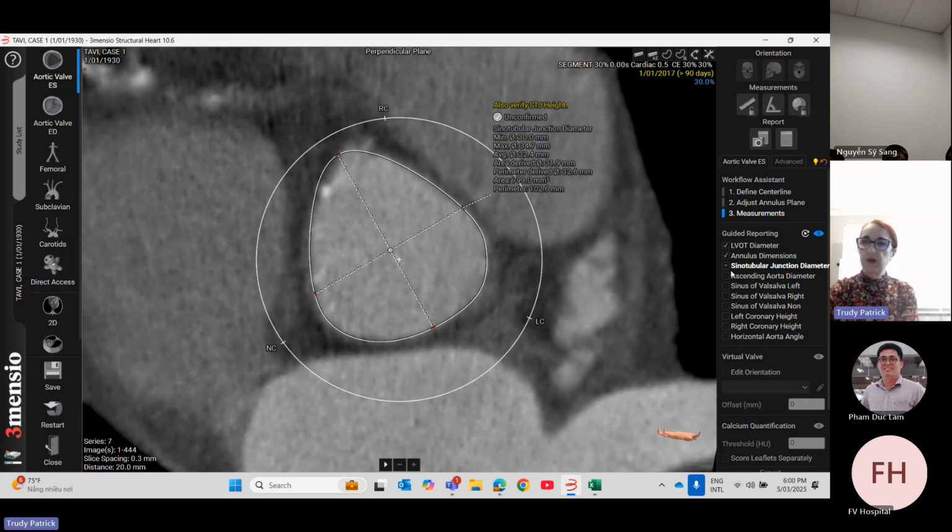Again, working through, we're going to the STJ junction, and again, we're just going to alter this a little bit.